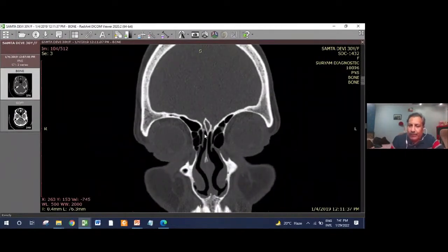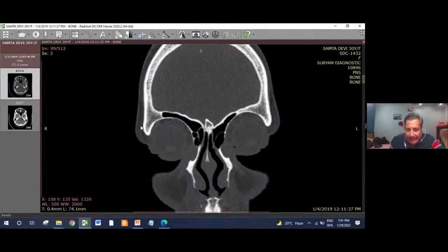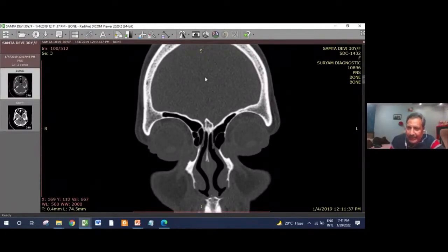The frontal sinus is over, and what cellularity you see, sometimes it is pneumatized. We have seen this cell pneumatizing even the zygoma, full of disease inside. So we need to see how the supraorbital pneumatization is. This is very, very important. The more the skull base is pneumatized in this region, the thinner it is. This region has a thin anterior skull base, which is relatively very thin, and if there is high cellularity here, the skull base becomes much thinner. The structures passing through the skull base become much more prominent.